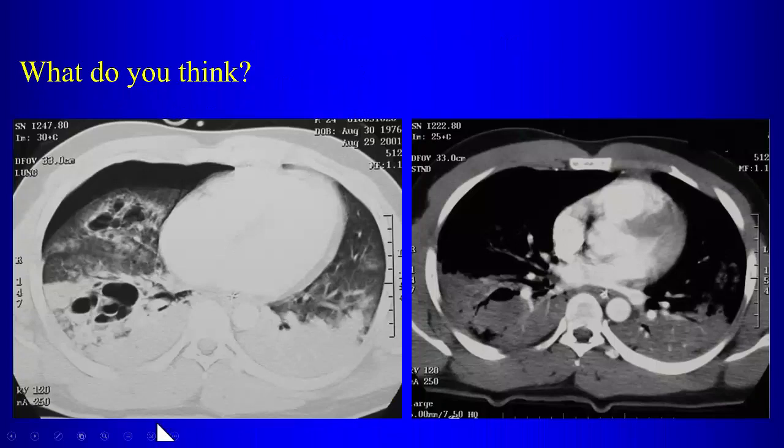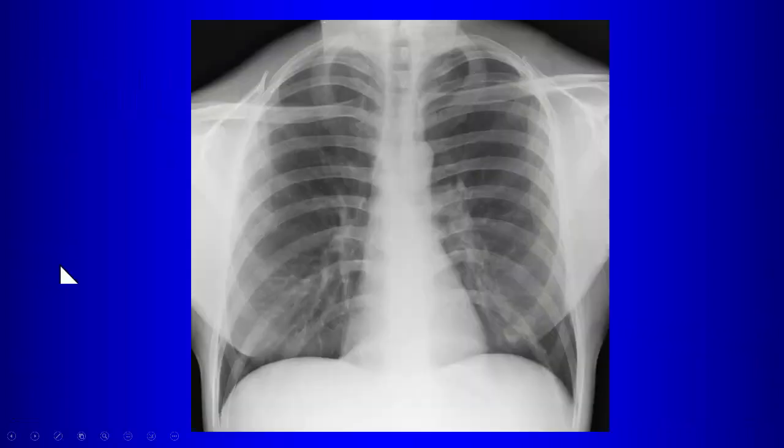So if I tell you that this is a trauma patient, what do we call these? These are pulmonary lacerations. So these are tears within the lung, and all of this is hemorrhage in the lung because of the pulmonary laceration. So you can see what happens over time as this resolves. This can convert into a pneumatocele with the thin-walled lesion there. It's an air collection in the interstitium, and then over time that will also resolve on its own. So it can be a sequela of pulmonary lacerations.